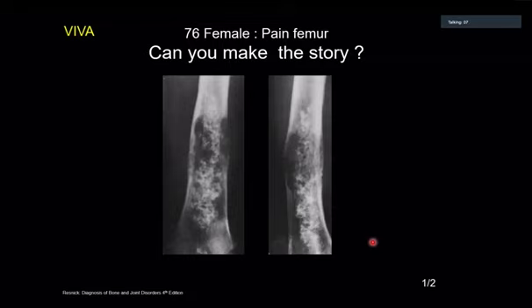These are the X-ray AP and oblique or lateral views of the tibia. This was the femur. I couldn't see the fibula, so it's my mistake. Femur, distal femur, which is demonstrating an aggressive-looking lesion in the distal diametaphysis with a wide zone of transition.